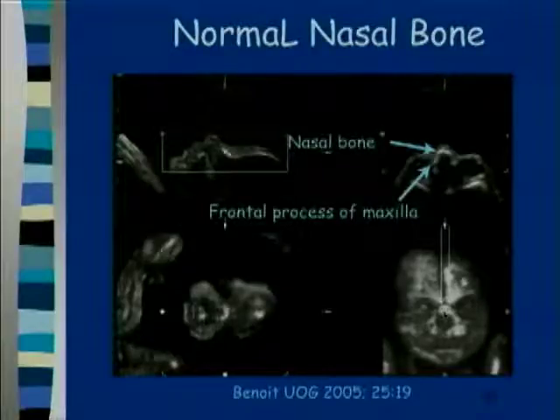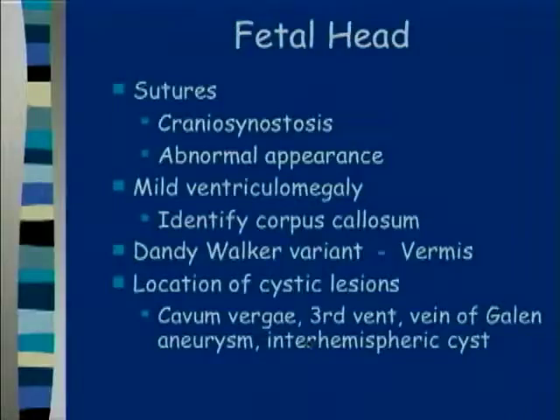These can be rendered, and you can see them on the 3D rendered view, but personally I usually use the 2D or multiplanar views to find it.